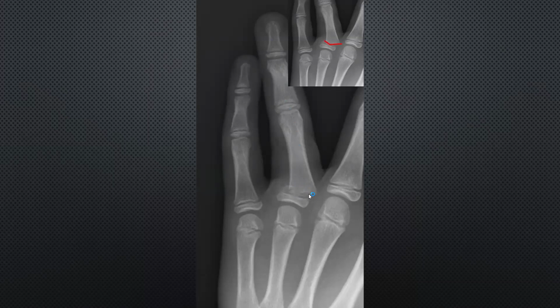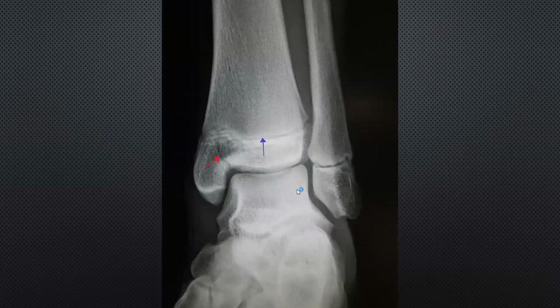This is slipped, not crushed. The fracture is above the growth plate. Above is type 2. So you can say the fracture site first: I can see a fracture in the ring finger proximal phalanx. It could be type 2 because it is above the growth plate. This is the growth plate, can you see? The fracture is above it.